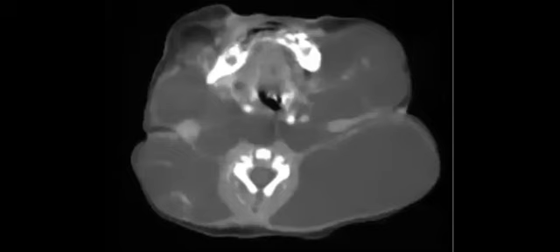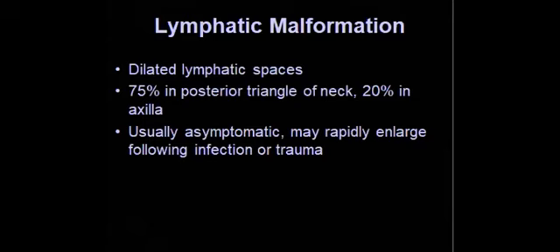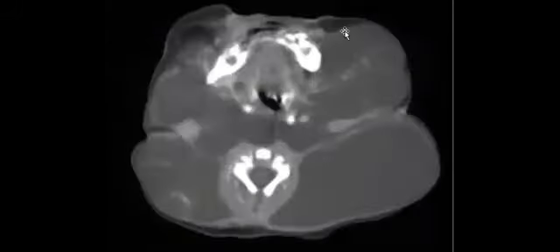Sorry, is the cystic hygroma the same? It can be a branchial cleft cyst, a thyroglossal cyst, but that is more midline and smaller than this one. It can be a necrotic tumor. Okay. So yeah, Rihan, good that you mentioned it doesn't respect the spaces, so it can involve all the spaces, right?